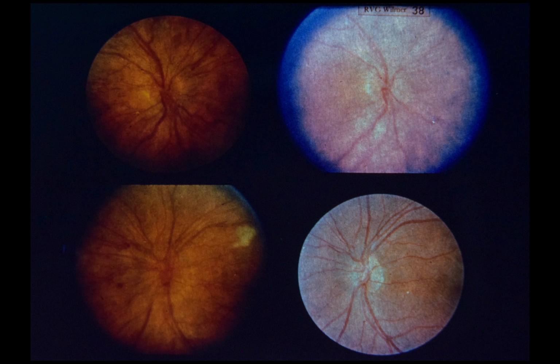Comment: the variable course of proliferative diabetic retinopathy was one factor which mandated the initiation of a randomized clinical trial, the diabetic retinopathy study. It was often quoted that up to 10% of patients with proliferative retinopathy had spontaneous regression of neovascularization. While we believe that this figure is probably inflated, the patient illustrated here demonstrates remarkable spontaneous regression of florid disc neovascularization in the untreated left eye.